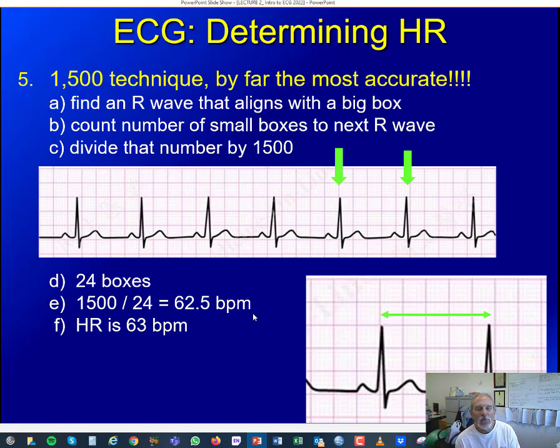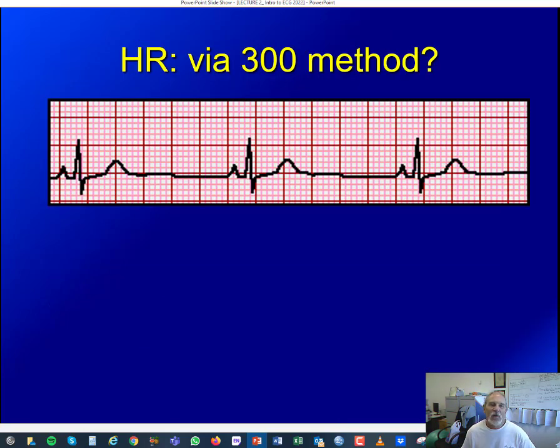Now, it's important that you realize that in healthy individuals, when you inhale, breathing, your heart rate actually increases, and when you exhale, your heart rate actually decreases a little. So we get some variability in that R to R wave. So on an exam, I will always highlight where I want you to take heart rate from or determine heart rate from. So I'll either use arrows, or typically I just draw a circle around two R wave complexes, two ECG complexes.